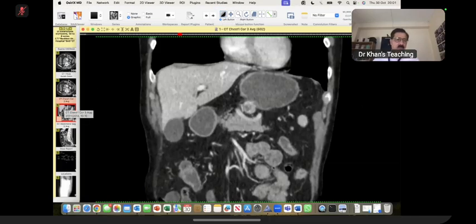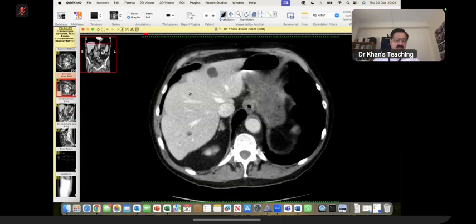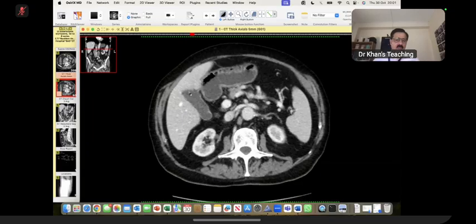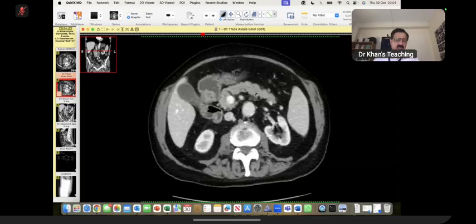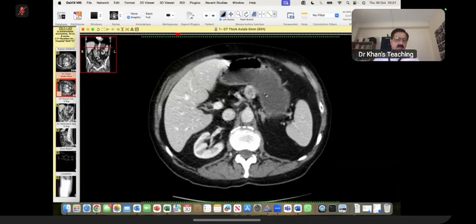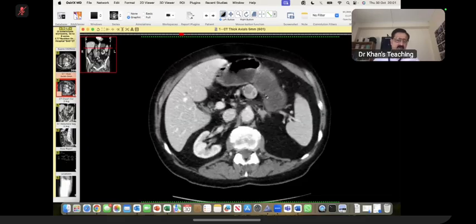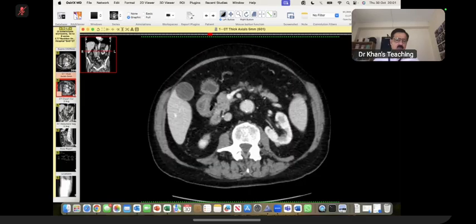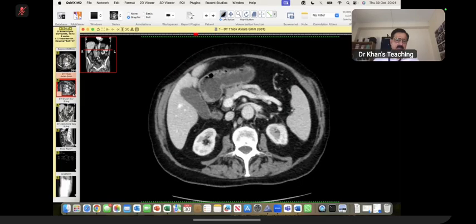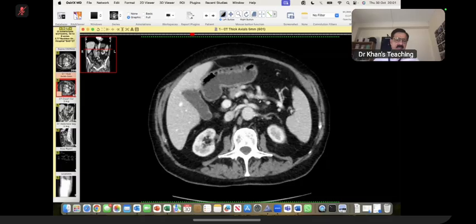Now, this is your second case, which is an extrapancreatic neuroendocrine tumor of the pancreas. Now, this is the pancreas. Around the pancreas, if you see something like this, it is a neuroendocrine tumor. Please remember that they can be extrapancreatic, and they can be multiple. There is a concept of the gastrinoma triangle, which is in this region where I am pointing out. This is the region you will see in your exam. You did well where you ruled out any rugal thickening, etc.